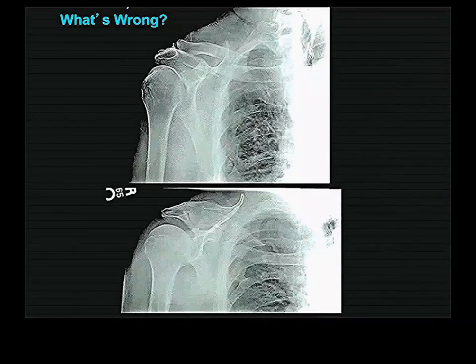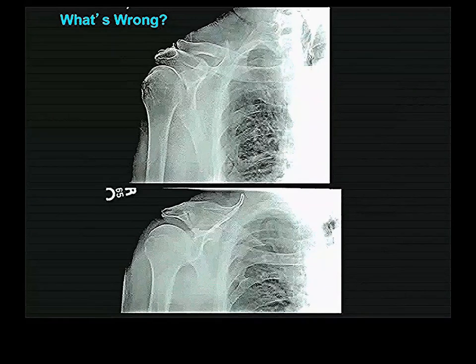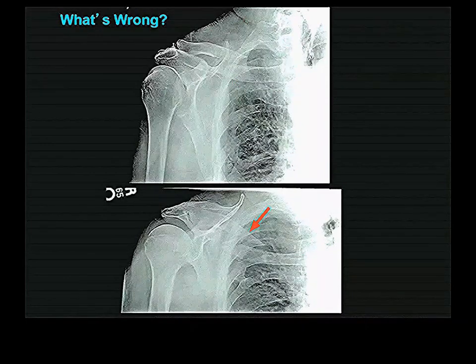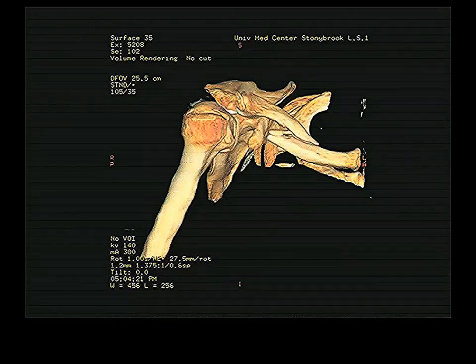Now this one, people should be able to tell what's wrong, in my opinion. All right. No one here is quite prepared to enter the orthopedic clerkship right now. I can't understand why. If I show you the volume rendered from the CT, you'll see what's wrong. Here's a clavicle piece. Here's another clavicle piece. This has a complete fracture of the collarbone. And now you can see, too, there's one clavicle piece and the other clavicle piece. These bones break, in other words.